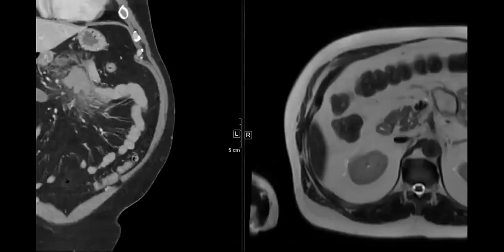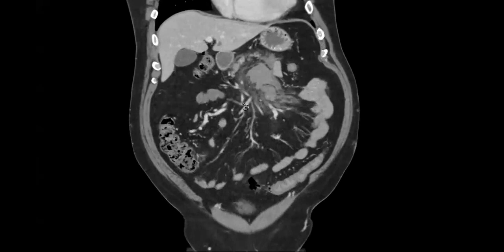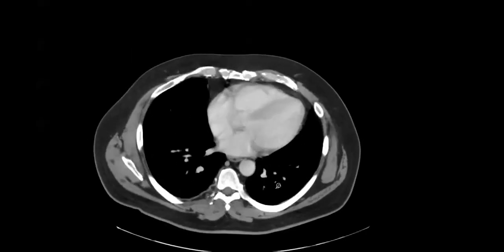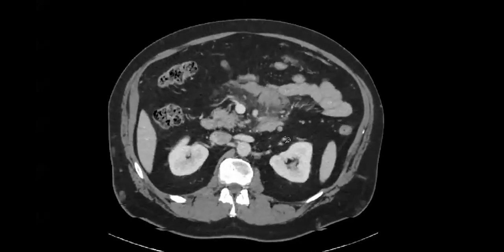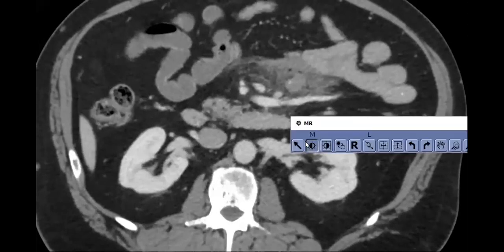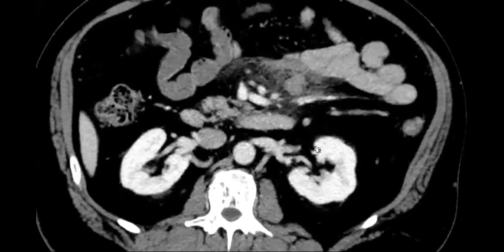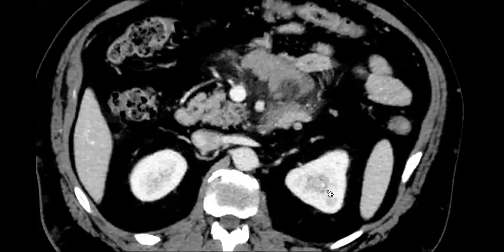And actually, I want to show you back on that CT. There was one thing. These are more frequently associated with pancreatitis and pseudoaneurysms. And if you look closely here, we thought there was a tiny little pseudoaneurysm here. It turns out this person was super hyper-anticoagulated with their Coumadin. And so we think this was actually just a spontaneous hematoma.